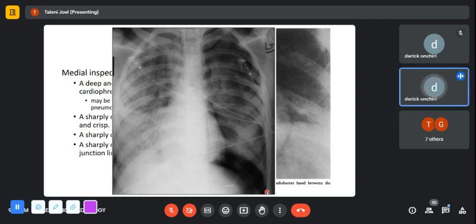Okay, so in this particular radiograph, which sign are we seeing in the left hemidiaphragm? There's a deep sulcus sign, as well as the anterior diaphragm sign. And also the hemidiaphragm being outlined by air above it.